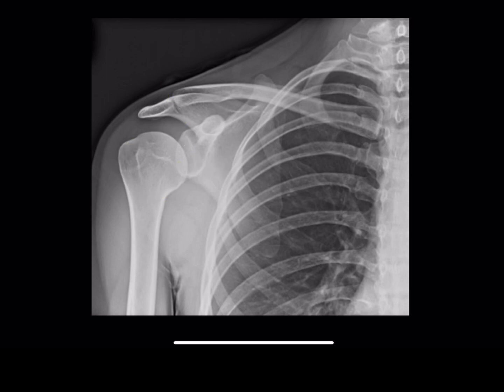then you should think of anterior shoulder dislocation. Thirdly, look at the acromioclavicular joint. The inferior border of the distal clavicle should line up with the acromion. If there is any step, think of acromioclavicular joint injury. If the acromioclavicular joint distance is more than 8 mm, think of AC ligament rupture. For the coracoclavicular distance, this is the coracoid process and this is the clavicle. If the coracoclavicular distance is more than 13 mm, think of coracoclavicular ligament rupture.